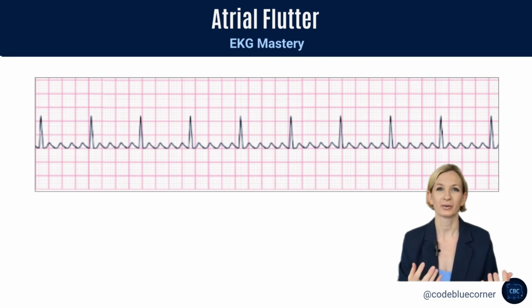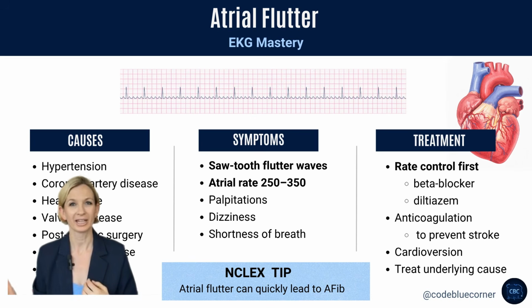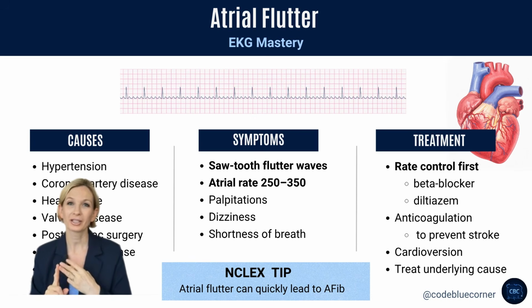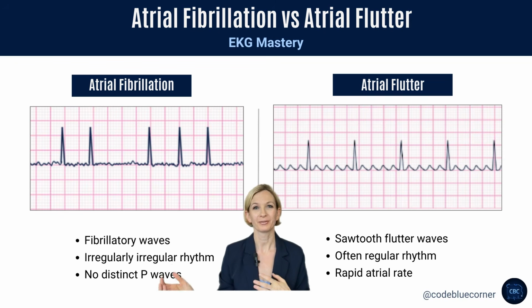This is your flutter wave. Causes and treatments are similar to atrial fibrillation. Rate control, anticoagulation, and synchronized cardioversion if needed. These two rhythms are commonly confused.